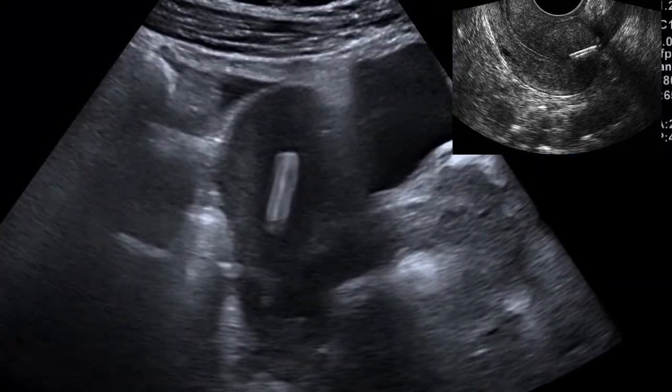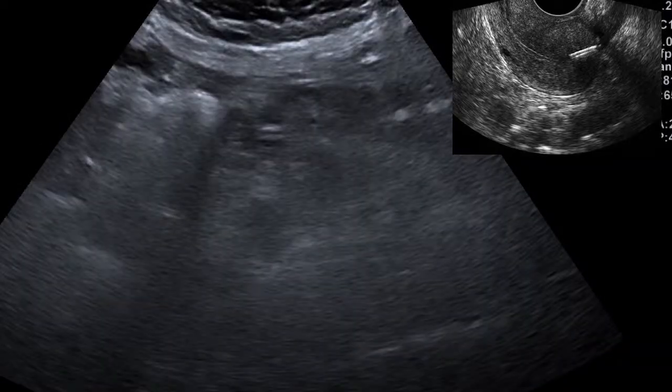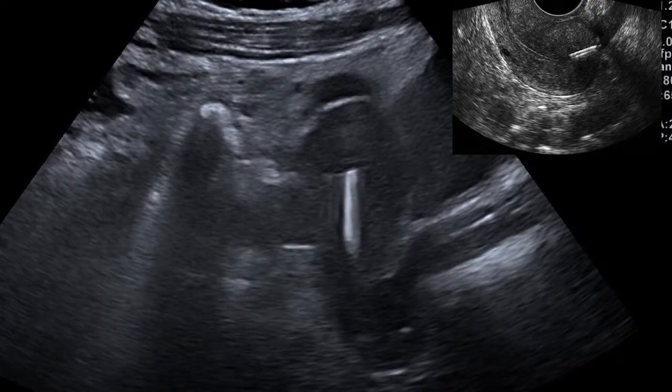So some of the complications that arise from the insertion of an IUCD can be malpositioning, which I've discussed, or a low-lying IUCD, then embedment of an arm within the myometrium, like what you saw in this image. So it's embedded there, and also perforation. You can also have perforation where it goes outside the myometrium of the uterus. It can also be expelled via the cervix. Then it can also cause pelvic inflammatory disease. So that will be PID.